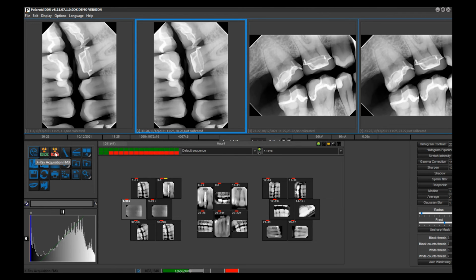Another thing, if you notice here, I have 3 different buttons for different X-rays. In your case, right now you just bought, I think, your Denmed X-rays. We can set them up here. If in the future you're buying Polaroid X-rays, we can set them up and label them. Versus some of the other software where you have to go back into the settings to choose the different X-ray you're using, here you just have a shortcut button.